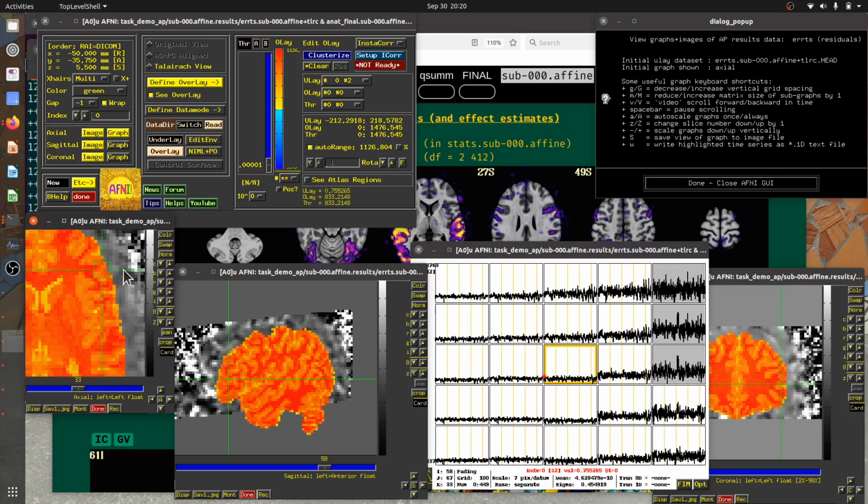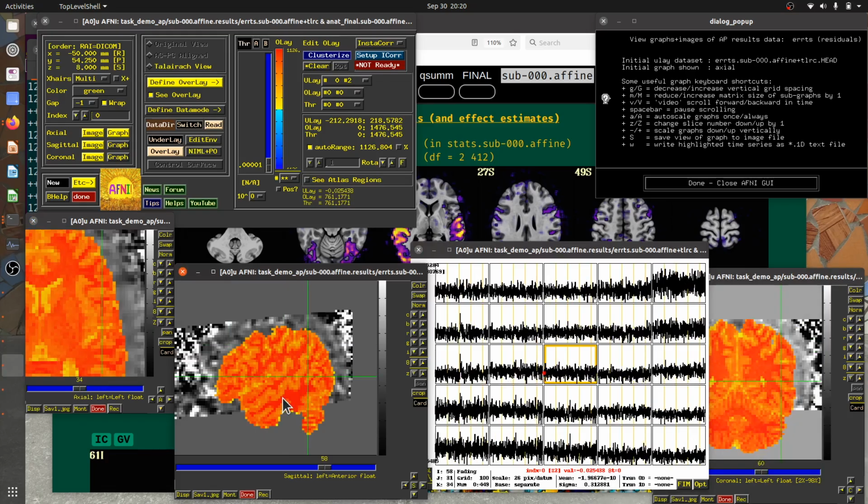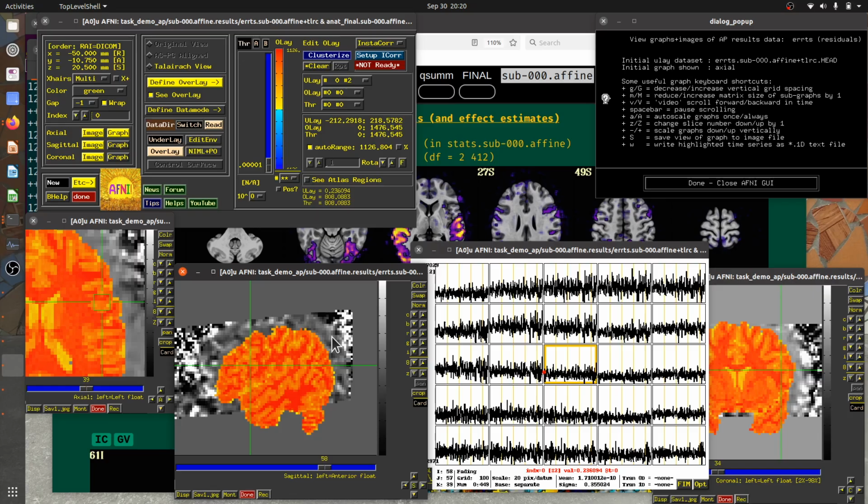So you can see that these 3 time series, when I didn't have the overlay on, that wasn't visually apparent. Okay, but this is useful for surfing around and seeing that I don't see structures here.